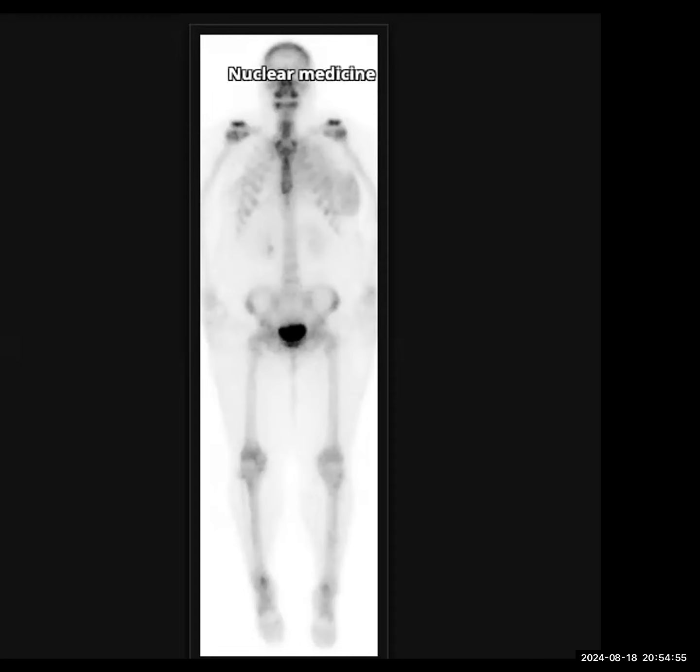Other than that, I'm trying to look for any abnormal intense focal uptake in all the bones. I don't see any obvious uptake in the skull. There is mild uptake involving the right side of the mandibular region. I'm suspicious of this. Other than that, there is mild uptake involving the bilateral lateral clavicles and also the humeral heads.